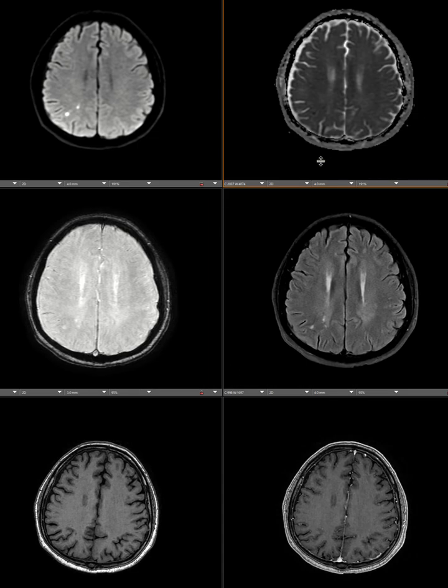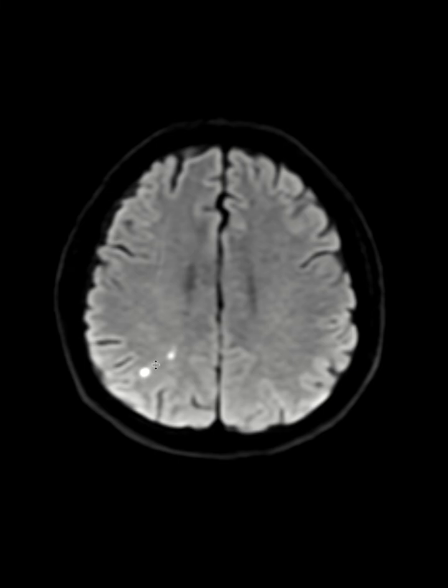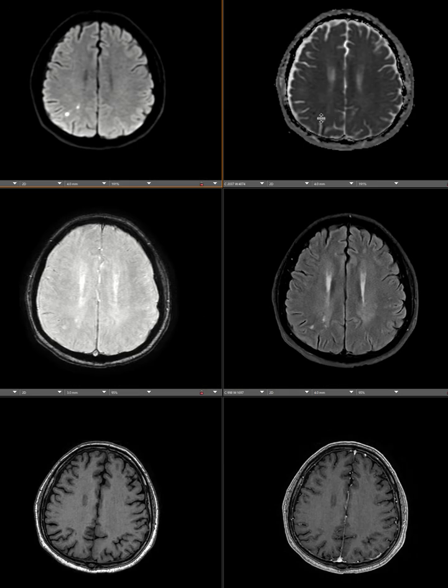Okay, after 1 week, when we have this acute infarct, we're going to go to the subacute phase. When we go to the subacute phase, we gradually decrease these dark signals on the ADC. So it's just going to get bright, but we still might see some areas of DWI bright, but it's just not going to have the darkness on the ADC map. Then we're going to see some areas of enhancement.